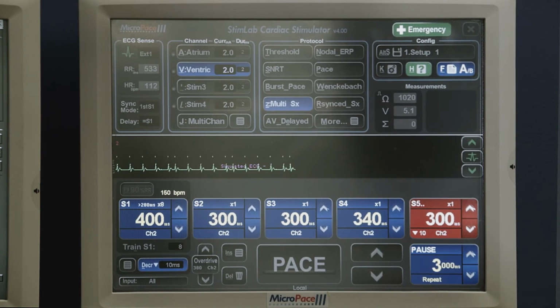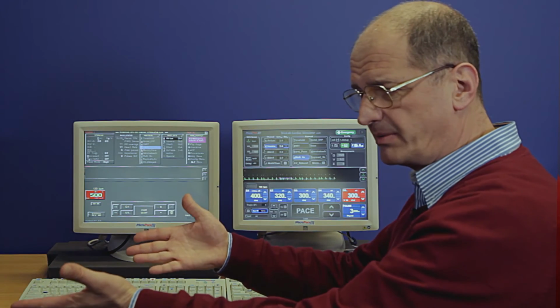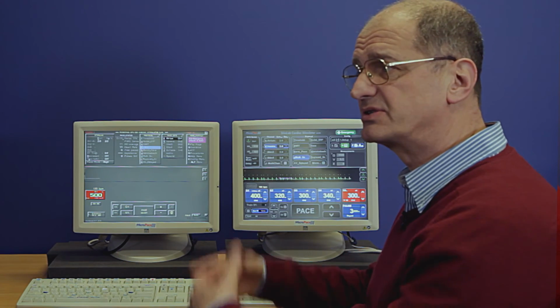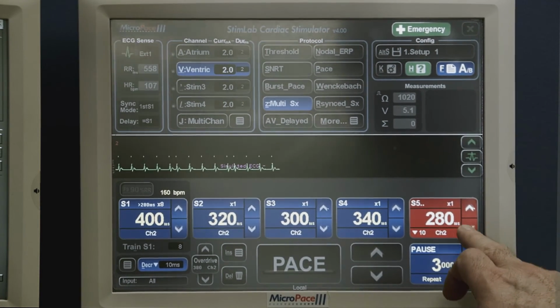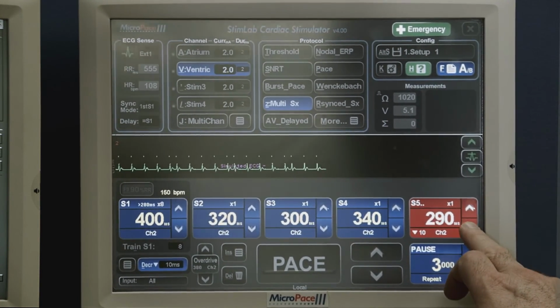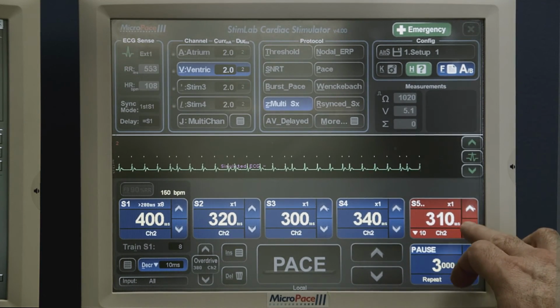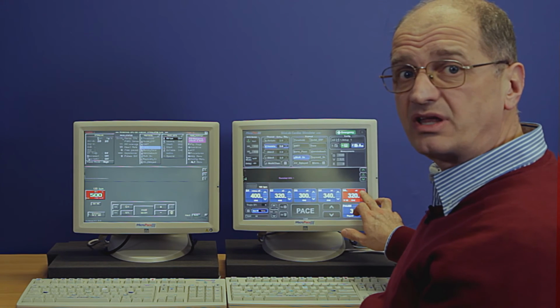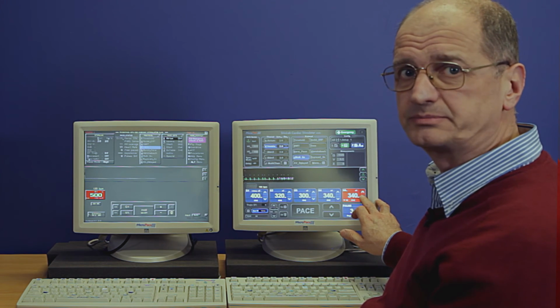The main benefit of that is that when a cardiologist is at a patient's bedside and is looking and focusing on the EP recorder signal traces, he may want to elevate or reduce the extra stimulus, and with the protuberances or the short touch buttons, he can actually continue to increase or decrease without having to look back to see whether he's still on the touch control.